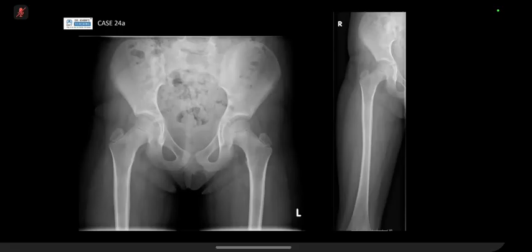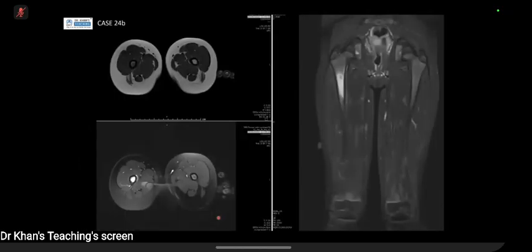Yes, exactly, you're right. There is periosteal reaction, so it's quite thin. You can almost say, is it lamellated? But when you look at it on the other side, not so convincing. I would say it's more convincing here. Now you decide to do a bit more because the soft tissues are quite okay, and I'm not sure the bone density is okay. Let's do more imaging. So you've done more imaging.